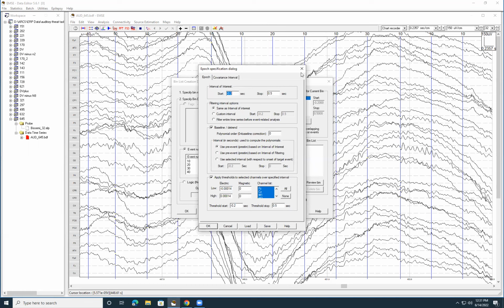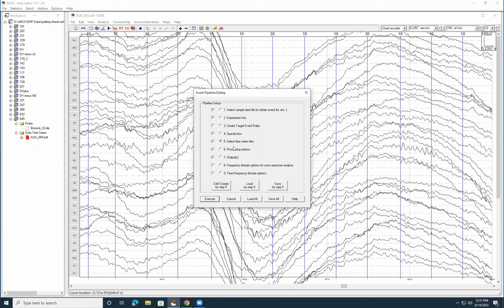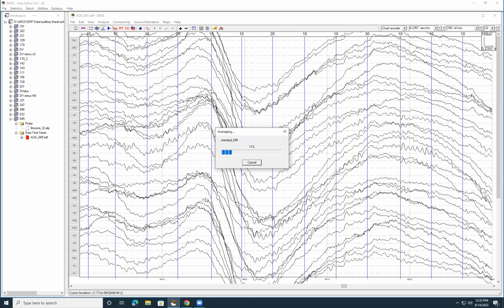Okay, since we're not actually changing anything, we're just going to close this out. I'm going to press cancel. We do our usual select time series. We clear all so that it won't have this one checked. And then we go do the ones that we're processing right now, which is just auditory threat 645. Yeah, right. Did that correctly? Now we'll execute. And then in a moment, I'm going to pull up the ERP script 120 and show you that there is a different number in that area where it's talking about excluding trials.